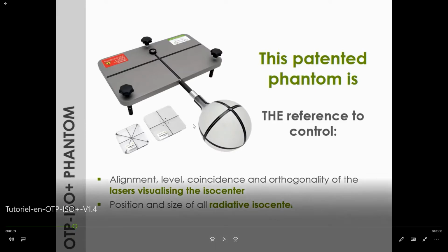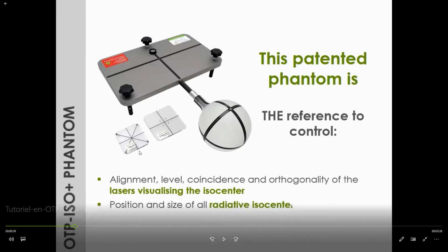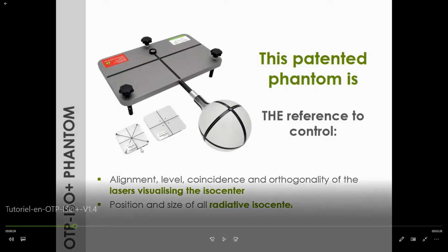The KV cross-test object is not used with Varian TrueBeams, as the tube is beneath the cover. TrueBeam uses isocal compensation, which always places the imager opposite the source. These two cross-test objects are used to compensate for the stray movements of the imager relative to the treatment source, which are due to the imager sagging when the gantry rotates. The center of the cross-test objects, formed by its four tungsten balls, creates a fixed reference point originating from the source. We set this up at the MV collimator exit and at the X-ray exit when possible.